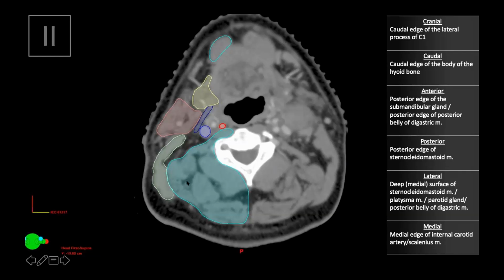Always remember, in this case, we're including vessels because their lymphatic channels flow along with the blood vessels. But all other normal structures, such as the muscle, the bone, the parotid, all the other normal structures have to be excluded from your contours. You only have to include the fibrofatty tissue that can harbor nodes and lymphatic channels. So never include your normal structures. When you're contouring here, please don't go into the parotid, don't contour over the digastric, because these are normal structures. These are barriers to spread of disease, and you won't have disease over them unless they are breached, of course.